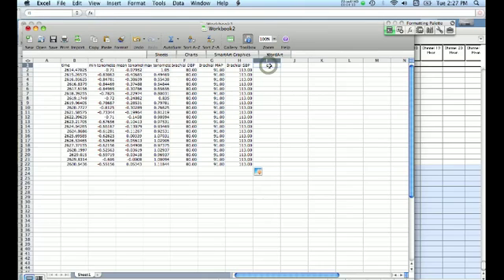So what I'll put down here is a forecasted tonometer value, which is the same as the carotid, or whatever, let's say carotid pressure, systolic.